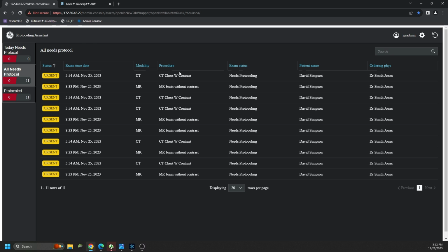John's friend David presents to his PCP for multiple sclerosis follow-up. Because his friend John was diagnosed with lung cancer, and since they were both heavy smokers, David decides to enroll in low-dose lung cancer screening.